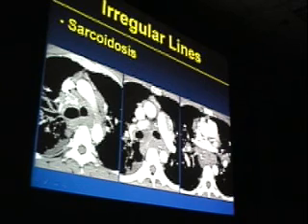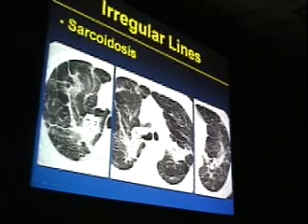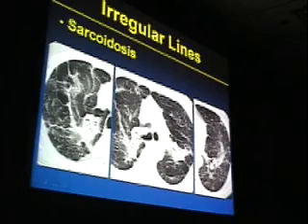Here's another patient with sarcoid, an ancillary feature, of course, suggestive of the diagnosis: massive, in this case, calcified lymphadenopathy. And when the process becomes very severe, we may see conglomerate areas of fibrosis, which is fairly typical in a posterolateral perihilar distribution. We may see central air bronchograms with many areas of conglomerate abnormality, other irregular areas of linear abnormality as well, very typical of end-stage sarcoidosis.